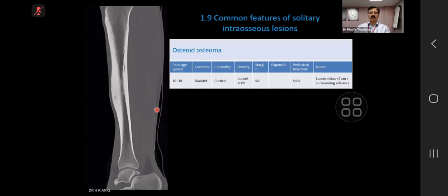Okay, very good. In this particular case, initially a nuclear scan was done, and the nuclear scan is not helpful. And this is a key exam point. Don't ask for a nuclear scan, because a nuclear scan is a sensitive tool but not a specific tool, and it shows uptake, and we are where we were. And on a CT scan, now I'm showing you this CT, just a single image.